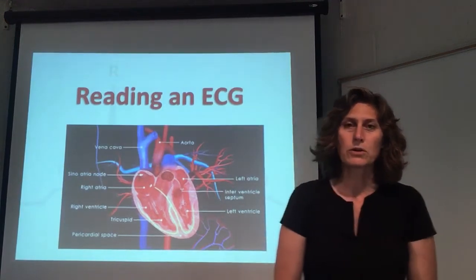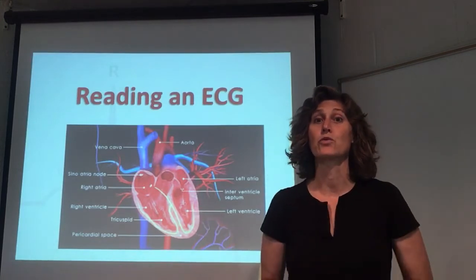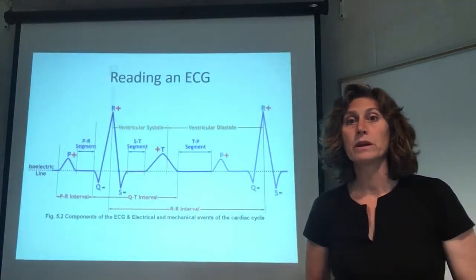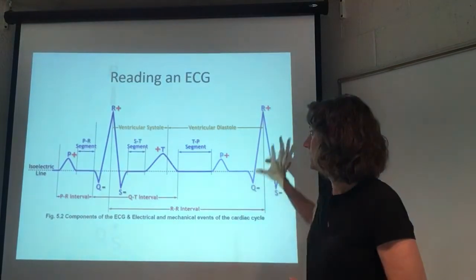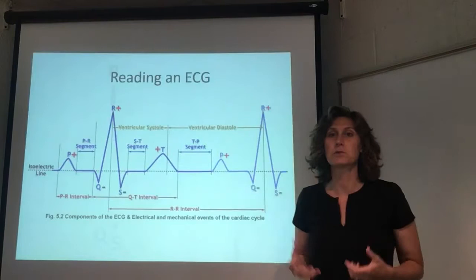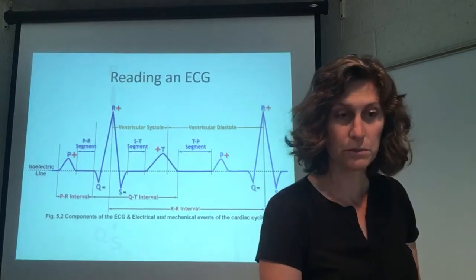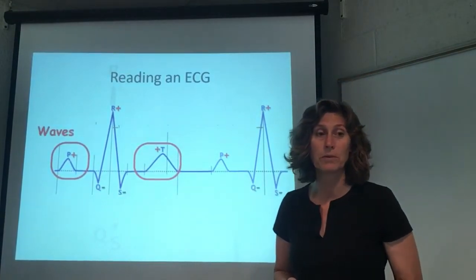Okay, part 3 of our electrocardiography series, I will introduce how to read the ECG, which will be important for your lab report. So in the introduction.pdf file, they gave you this huge image that is really hard to break down when you're first trying to orient yourself to the various pieces. So I'm going to break it down in a simpler way and highlight the various parts that you're going to need to know about.